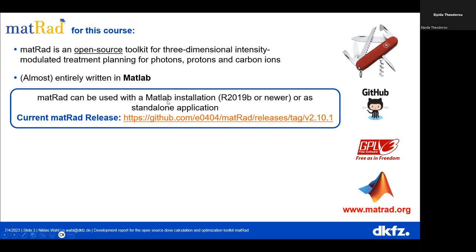If you have MATLAB installed, that really only applies if you have it installed, you can work with the application source code directly. MATLAB is a scripting language and you can just run it from the MATLAB application. If you do not have MATLAB, then you need to install our compiled version of MatRad.